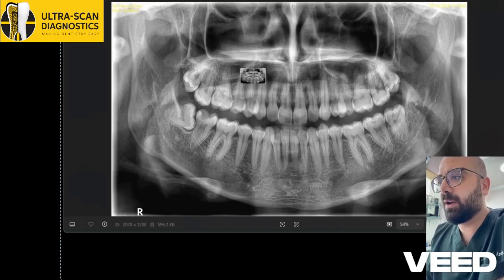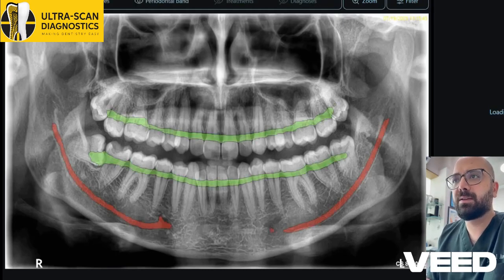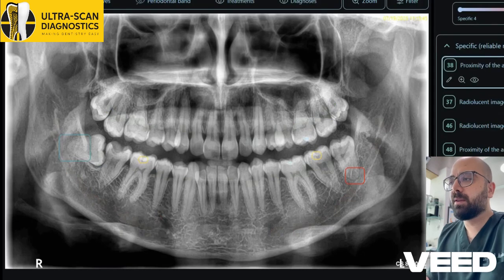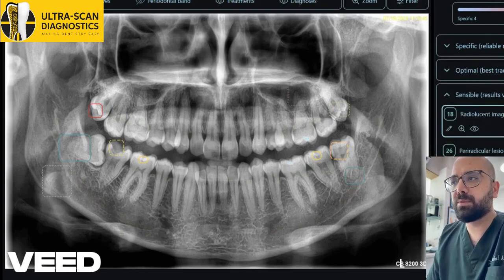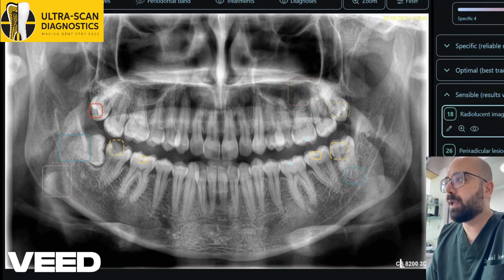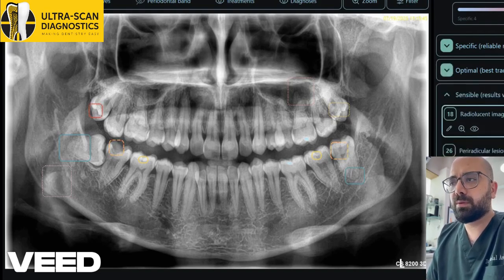You can see it right here on your screen. We're going to put it on the AI software. The AI software is now analyzing the results. It's just fantastic. You can see how the results are being verified. This is the periodontal charting. We've got the inferior alveolar nerve, and then we've got all these pathologies and problems that the AI has found. Now we're going to go ahead and verify these things because that's something that a dentomaxillofacial radiologist has to verify.